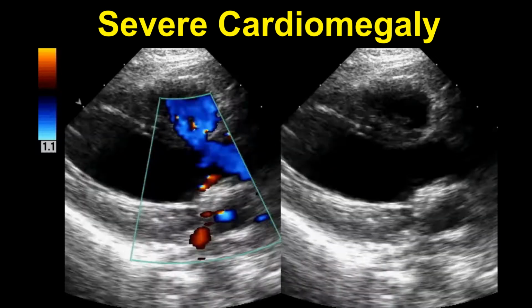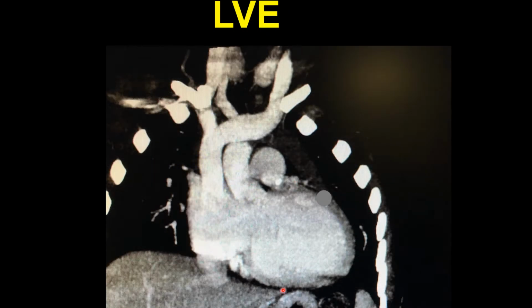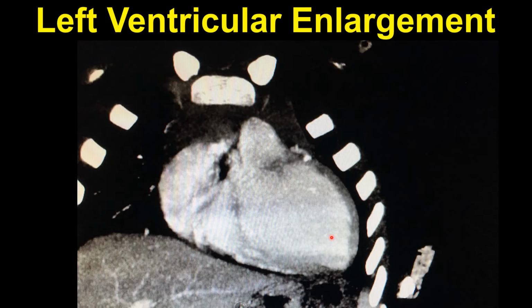Where you can see them more clearly. As you get older, it's not quite. So here's our cardiomegaly. It was really impressive, and this was read as severe cardiomegaly, and I agree. It almost fills the chest here. This girl is all heart. So again, we can see the cardiomegaly. We can also see some damage to the myocardium here, and this is the area of the septum where we're going to see that ventricular septal blood flow.